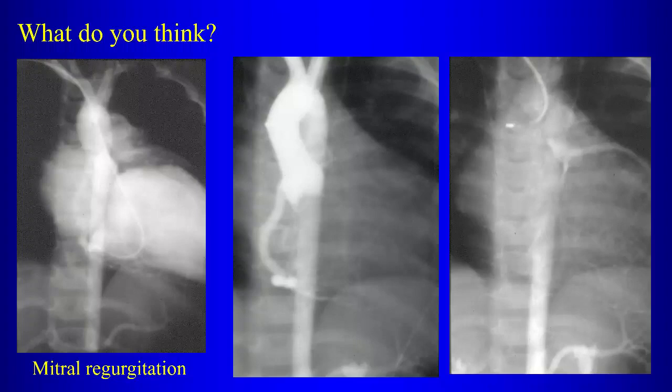Is that aberrant? Yeah, aberrant. It's like stenosis at the beginning of the left. Well, why are the left coronary arteries opacifying after the right coronary artery? Aberrant origins? From where? Where's it going?